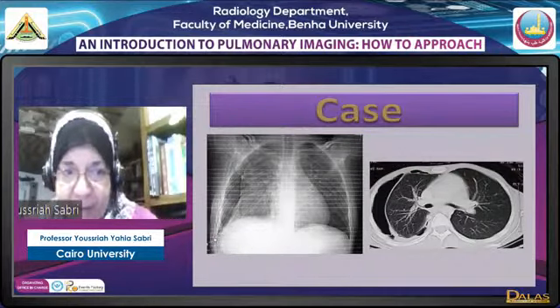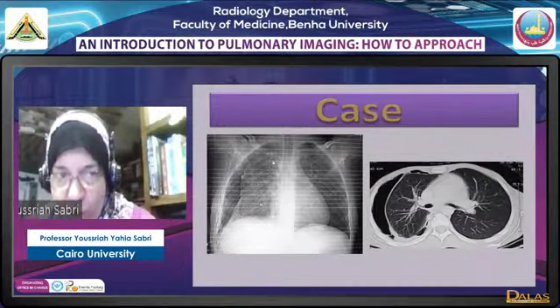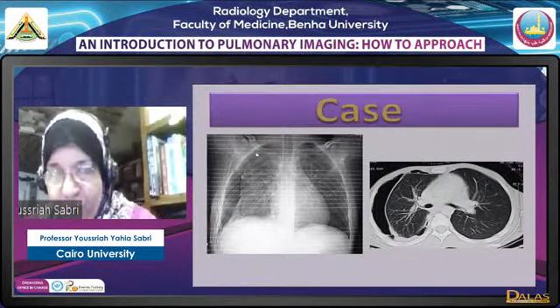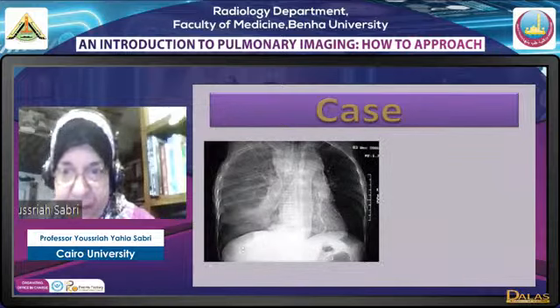Pneumothorax should have a deep sulcus sign. This is jet black, so this is air. Air should not be seen laterally. If there is air, it should normally be medially and inferiorly, not laterally and superiorly. If we see air in an abnormal position, even from this scanogram, it suggests loculation. It's not free to go.